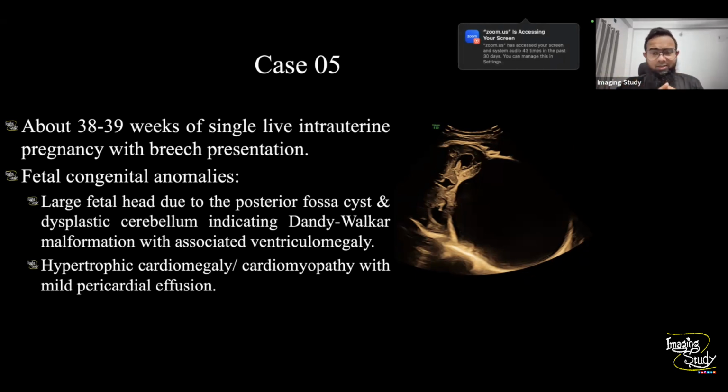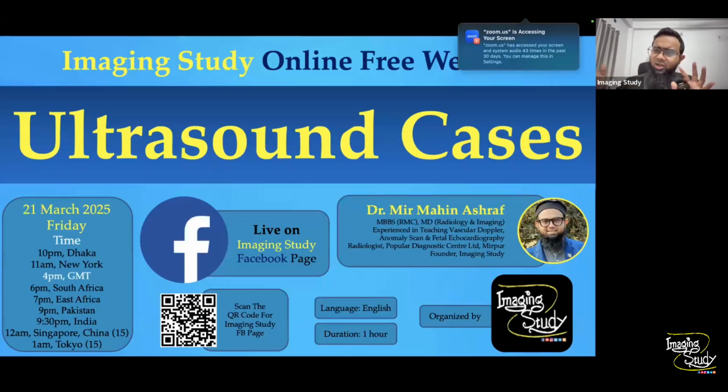Still, there is no arrhythmia present. So try to use these terms carefully. There is a minimal or mild pericardial effusion present. So we mention it because we want to inform the clinician that the heart condition is getting no better. So if you want to go further, you want to go for a Doppler evaluation, then you may see some other findings present. That's all.